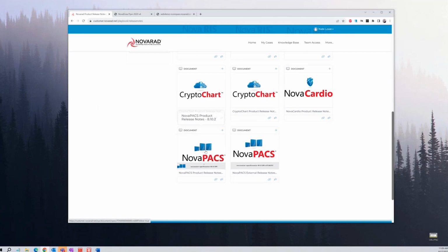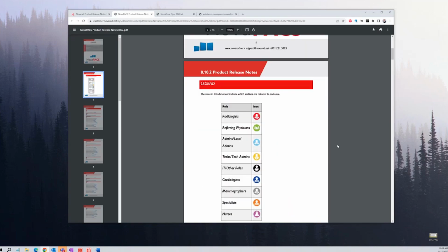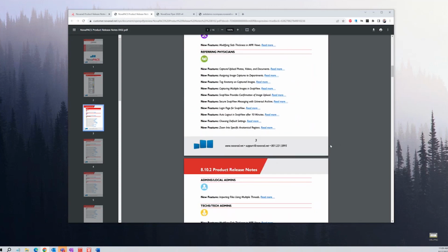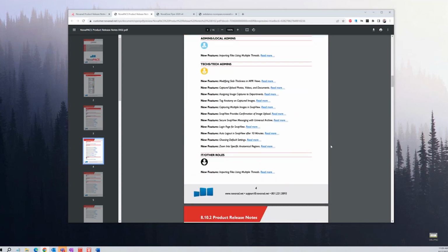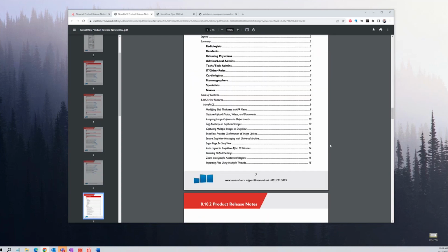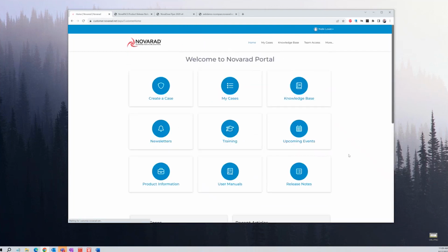That's 8.10. Okay, so let's say they want you to go to 8.10. So I'm going to click on that. It's going to tell me what has changed so I can prepare my team for any sort of a new feature that has been released. So I hope you all find that helpful.